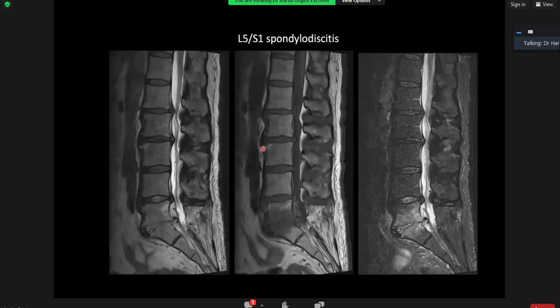So follow-up imaging 2 weeks later shows florid spondylodiscitis. So look at the T1 imaging. T1 imaging is the most important imaging for picking up early infection, where you will see end plate signal changes. So if you look, this is normal T1 signal, look at the end plate here. The T1 shows replacement of the normal signal, and there is florid spondylodiscitis.